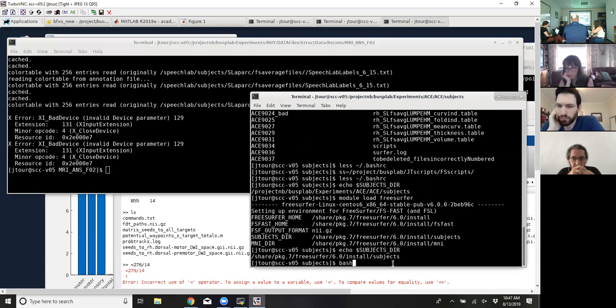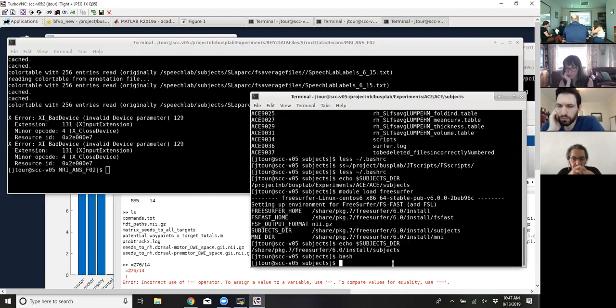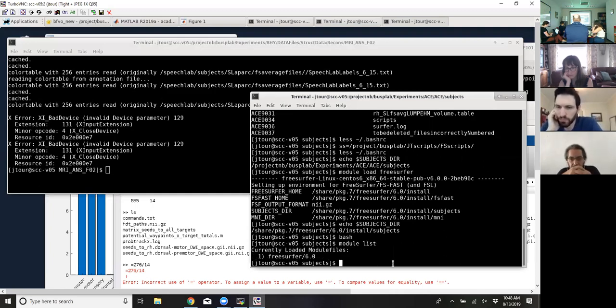So one of the things you can do though, is I do bash, and now I do it. No, that doesn't work. I was going to say, if I just do bash, it'll rerun that. But I also believe that it got rid of.